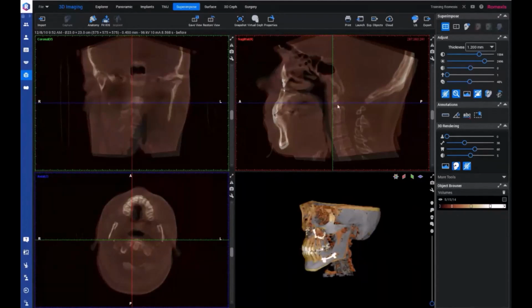And one thing that I also want to mention here is that let's not look at the spine. Those areas might change depending on the position of the patient in the imaging. But for example, here I know that the changes of the treatment should have happened around here. So what I want to check is that I have this area of the image well fitted. And at the end, it's quite easy to see when it's well fitted because the image gets sharp. So I will show you how that happens.